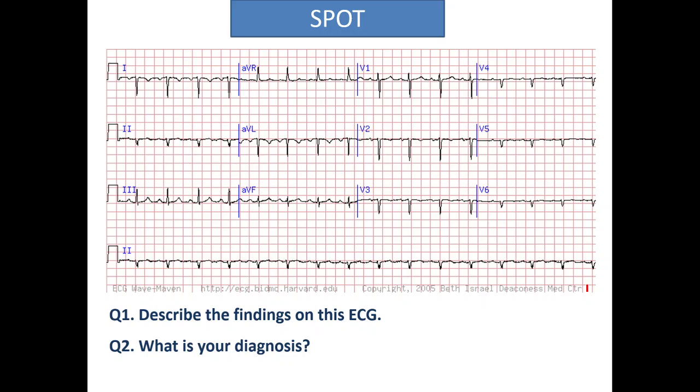So again another ECG, findings and what is the diagnosis. Go through it, try to make the finding. The clues over here are, look at lead AVR, look at the R wave progression, and look at the axis. The follow-up question might be how to differentiate between dextrocardia and wrong lead placement. Diagnosis, I hope you got. Dextrocardia.